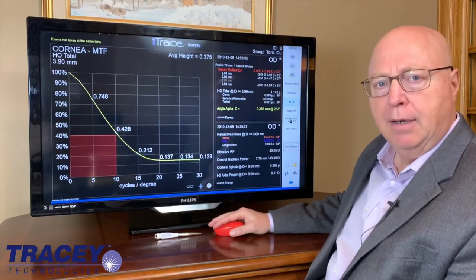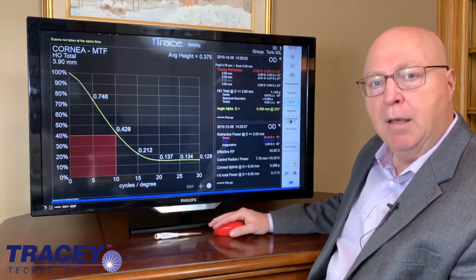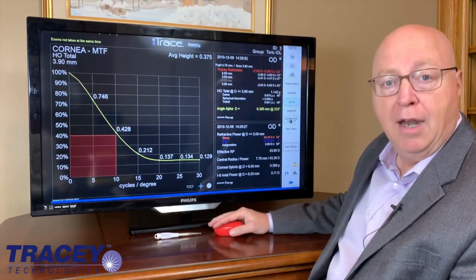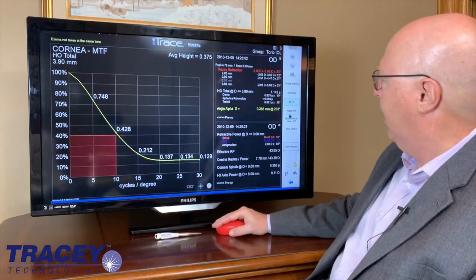How do you use it in iTrace, and frankly, why do you use it? Well, let's review a case and we'll talk about it, because it's actually an excellent way to screen out patients who should not get a multifocal or a premium lens because of their corneal aberrations. Let's take a look at the case we're using today.